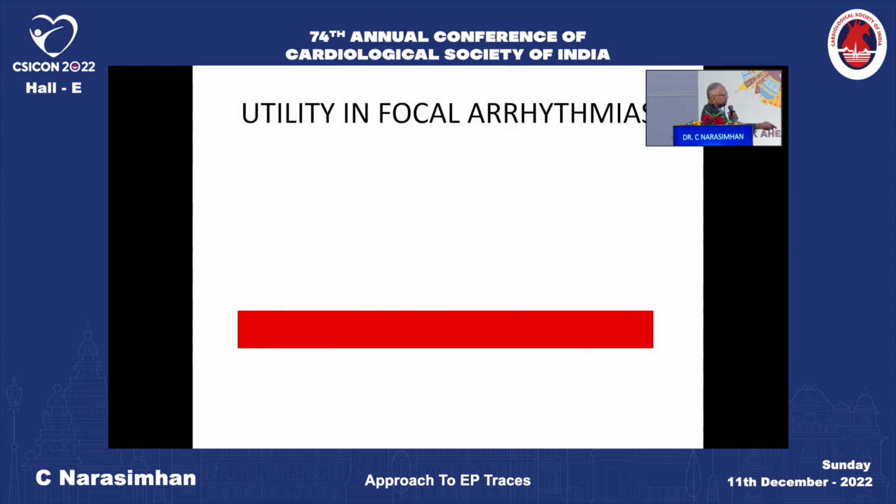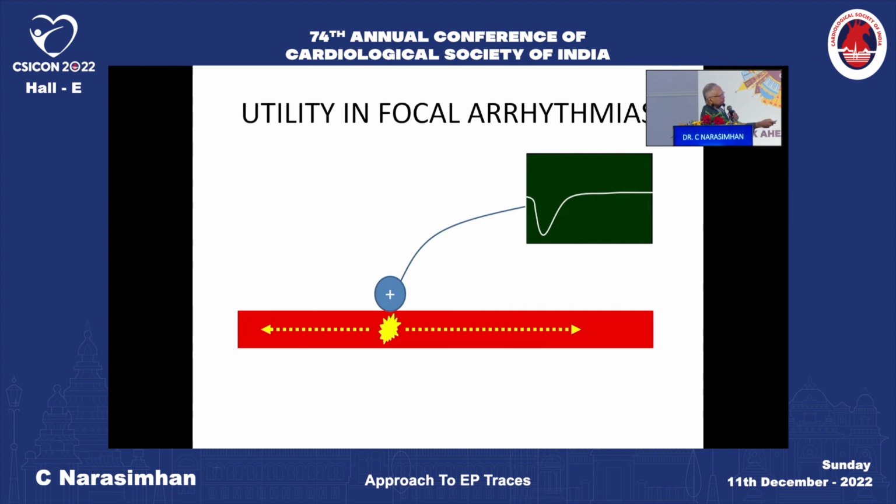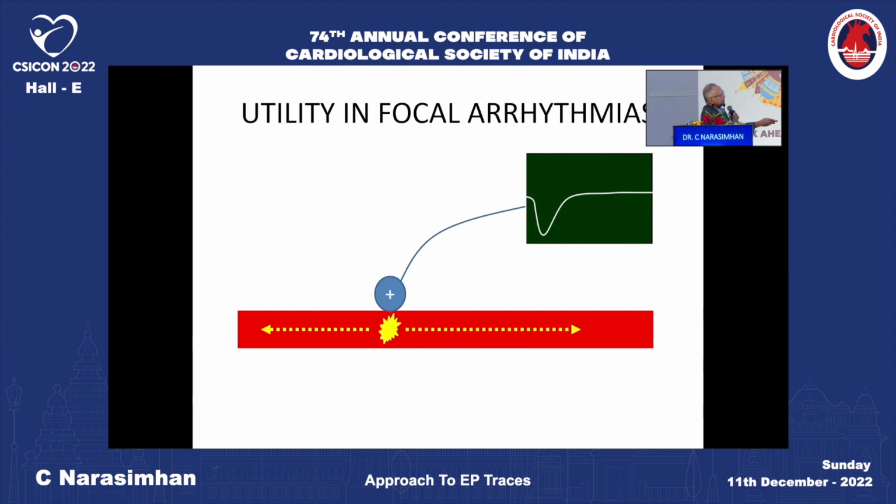Suppose you have a patient with a recording electrode there, and your recording is just on the site of activation. Then you will have a completely QS complex, and this descent, which is called dV by dt, is very rapid at the onset of activation.